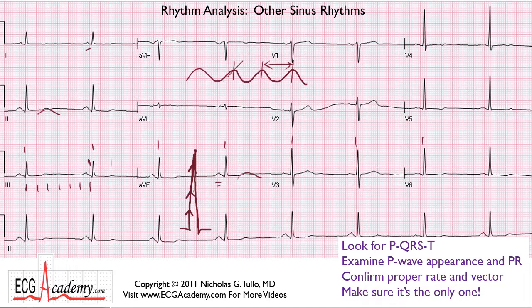The slope of the T wave is actually rather low. It's not a sharp, spiky looking signal. P waves tend to have an intermediate, a little bit sharper, a little bit higher frequency signal. They tend to change a little bit faster, certainly faster than a T wave, but not as fast as a QRS. So the QRS has the highest frequency component.